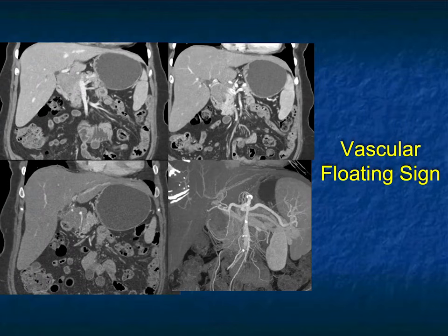This tumor in the porta hepatis, you can see the vessel encasement like the GDA and hepatic artery here. You can see the tumor infiltration and some nodes. Again, you would look at this and say perhaps lymphoma is indeed a good thought.